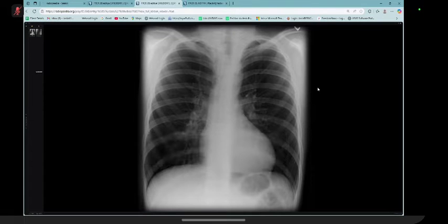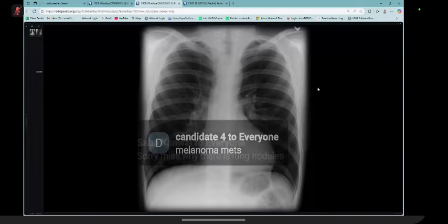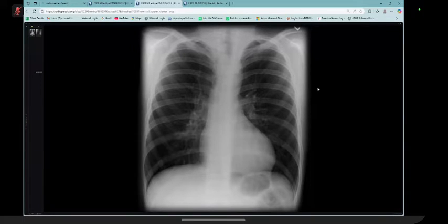At my first glance, I could not make out any lung pathology. There was no pneumothorax or pneumomediastinum. Both costophrenic angles were clear. Although the spine was not clearly seen, in the visualized bones I could see bilateral inferior rib notching in the upper ribs.